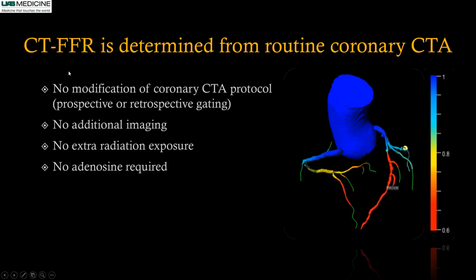Now it is possible, because of computational fluid dynamics, to get the same information from a non-invasive coronary CTA. There is no modification of the coronary CTA protocol. No additional imaging is required. There is no extra radiation involved, and the patient does not need adenosine as compared to the invasive FFR. So currently you send this data remotely to a lab, which is the HeartFlow lab, and they will compute the data using a supercomputer and send you this kind of nice colorful images.